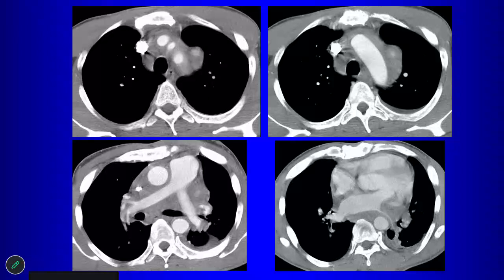So what might this represent? Could be like fibrosing mediastinum. Yeah, in terms of the differential though, what neoplasm would you consider? Lymphoma. Lymphoma, yeah. And that's usually why these patients need to go to biopsy. You want to differentiate lymphoma from fibrosing mediastinitis. What's the most common cause of fibrosing mediastinitis? Histoplasmosis. Histoplasmosis.